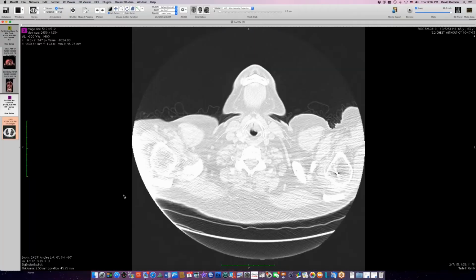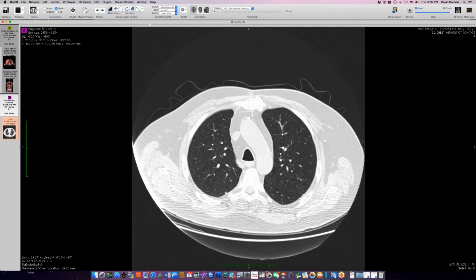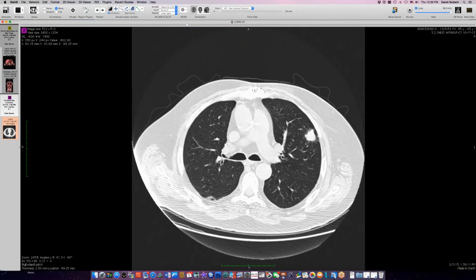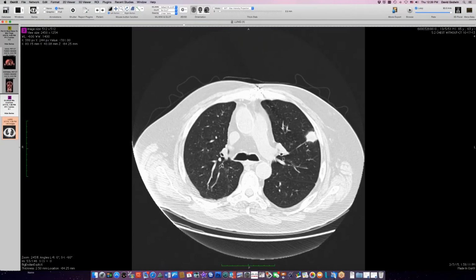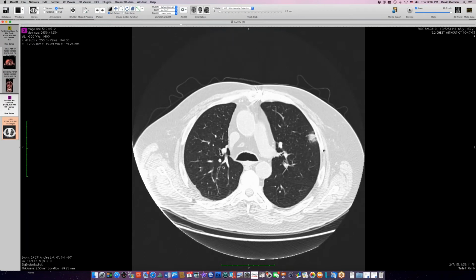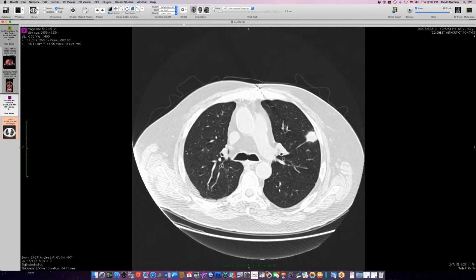And here's a person who'd had a transplant and developed a lung nodule on the left. And it's a ragged-looking nodule up here. So in our setting, the people who are compromised with transplant will get Aspergillus, Cryptococcus, and Nocardia as the usual causes of lung nodules. And we also have to consider lymphoma in the differential diagnosis. So it could be an EBV reactivation in the setting of transplant immune suppression.